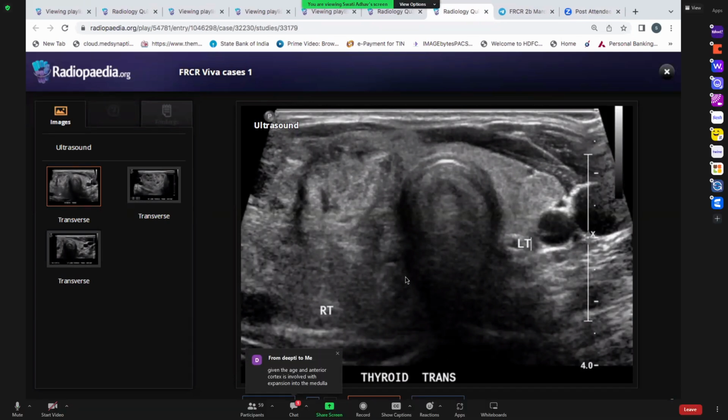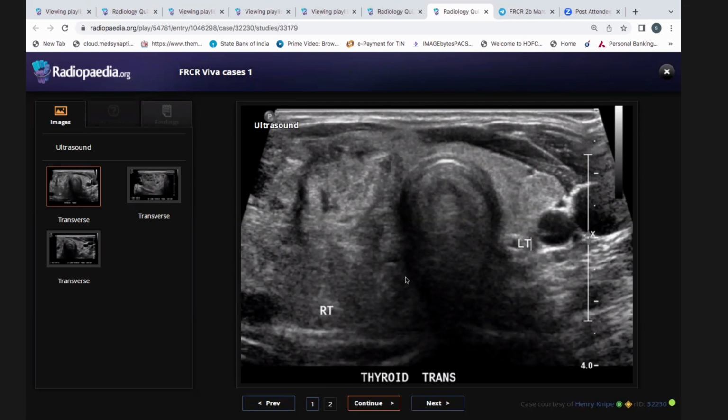Candidate 2. Yes. This is an ultrasound of a female who has presented with some husky voice. You can start. Yes. I'm provided with the ultrasound images of the thyroid scan. Here I'm able to see a heterogeneous lesion with a peripheral halo in the region of the right lobe of thyroid. Posterior to that, I'm able to see a hypoechoic lesion along the right side of thyroid. I would like to see the other images also.